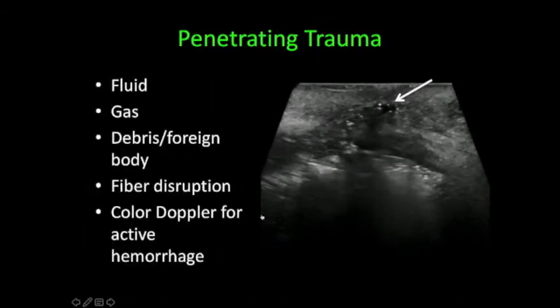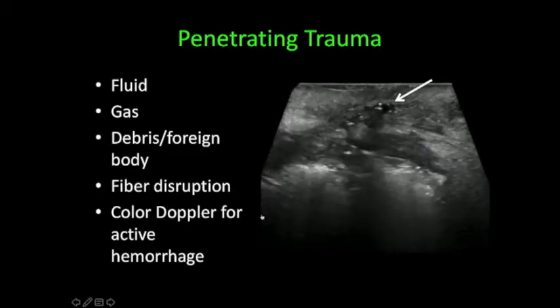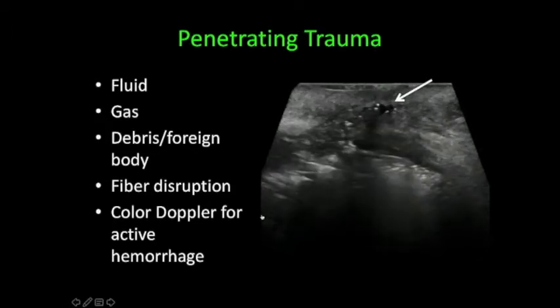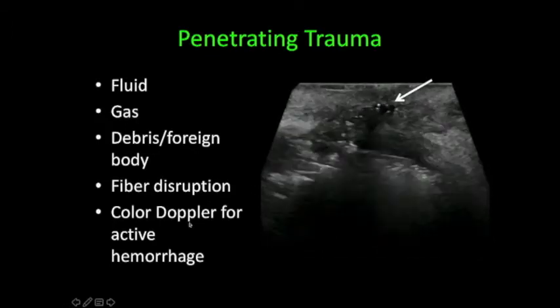And lastly, for penetrating trauma, you would see similar findings in the other types of trauma. But in addition, because of the break of the skin and the subcutaneous tissues, think about the possibility of gas, foreign bodies that you may see.